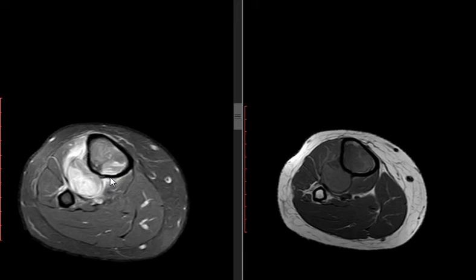It is an aggressive lesion, it must be aggressive. When we say aggressive, it is one of two types of lesions: infectious, meaning osteomyelitis, or malignant. Only these two we call aggressive. Does this look infectious or inflammatory, meaning osteomyelitis?